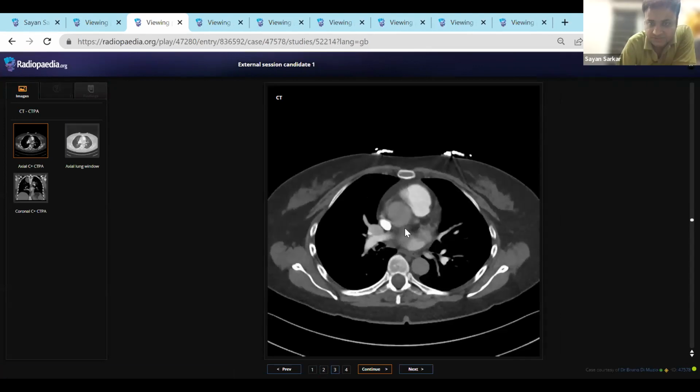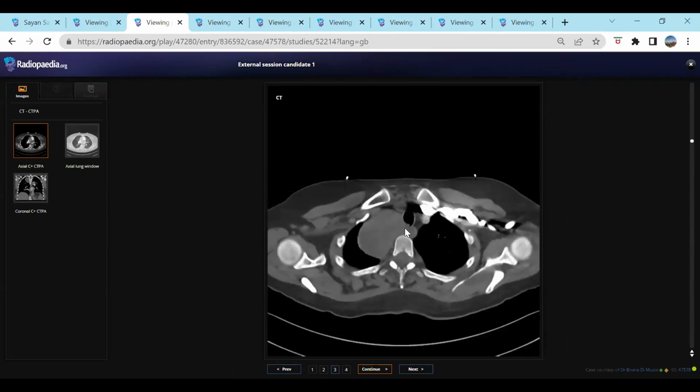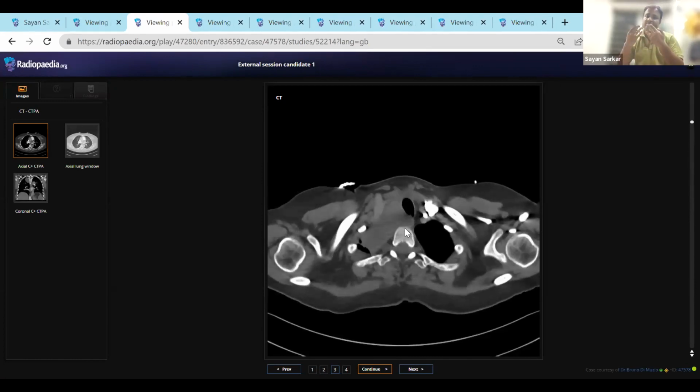I will just try to show that if possible. Yeah, so this was basically a goiter. The moment you say yourself it is arising from the neck, it is most likely a thyroid mass. You don't have to tell about the esophagus anymore. And the other thing is that for thyroid, as you said, first is ultrasound, and if needed, they can do an FNAC or a biopsy under ultrasound imaging only. And then, since it's a benign-looking thing, you probably don't need any further workup.